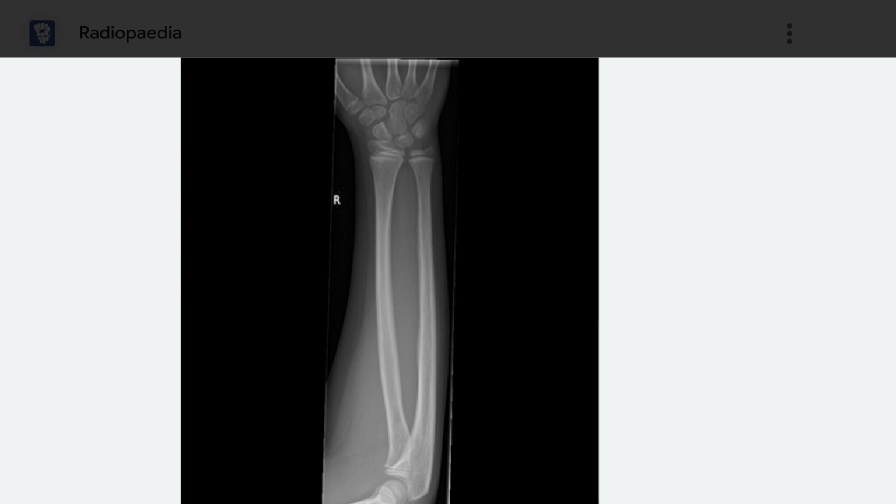Nowadays, digital radiographs contain all this information. Lastly, you should mention the date of examination, as follow-up radiographs would change for pathology. X-rays are read either from inside out or outside in approach. Commonly we follow the former approach.